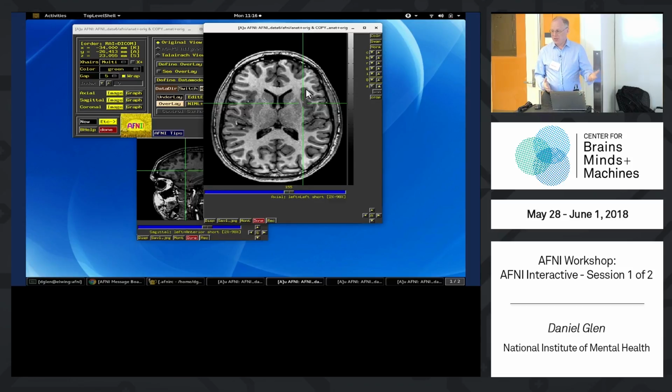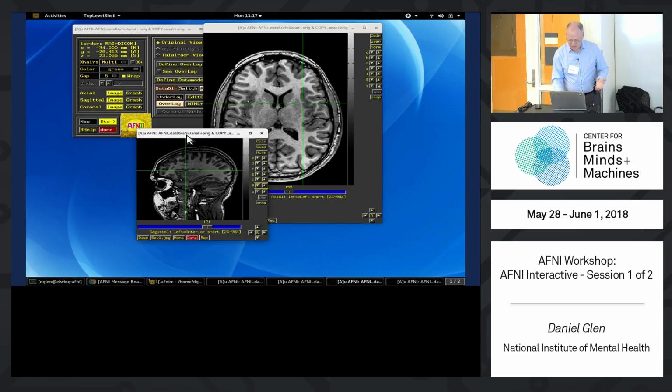How do you know which one is really left or really right? You could have a vitamin E capsule. If the animal or human has surgery on one side, then you can know. But it's almost impossible to know by just looking at it. Because you can do the same thing with the sagittal slice. We can do the L key over that too. But generally, it's easy to tell the front from the back. Even that problem has happened too. You've gotten backward brains too, but mostly you can tell front from back.